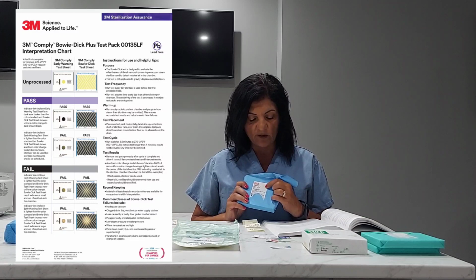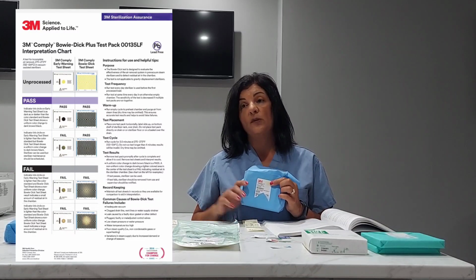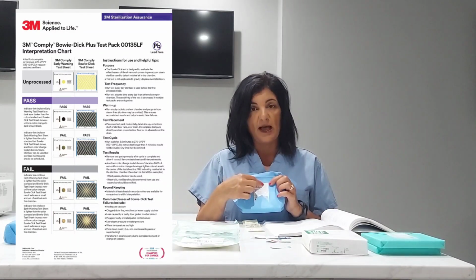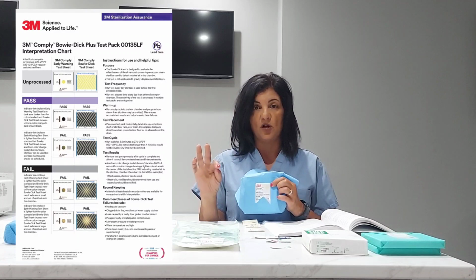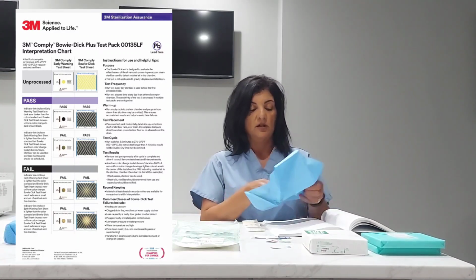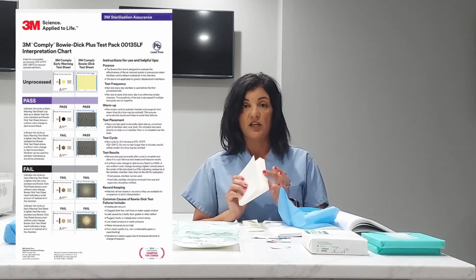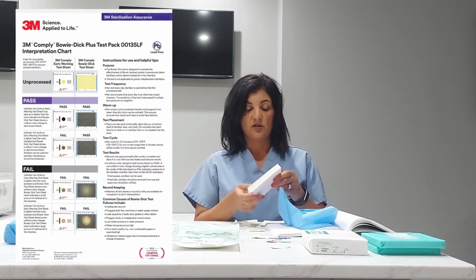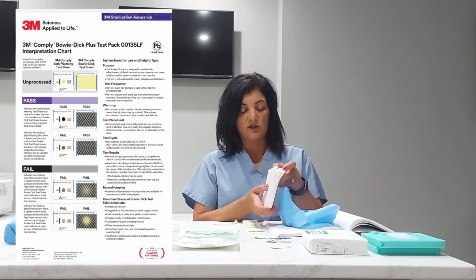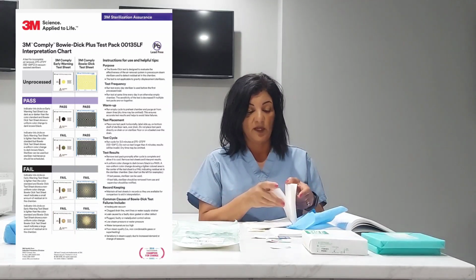So when you open these up, well, first, I know this has not been exposed to sterilization because this yellow dot, or this class 1, is still yellow. Once it's been exposed to a sterilization cycle, this dot turns black. So again, it's my first visual to know that this has or has not been exposed to a sterilization cycle. Once I open it, I see all these cards in here. This is my challenge. There's a foam in here, there's all these thick cards.